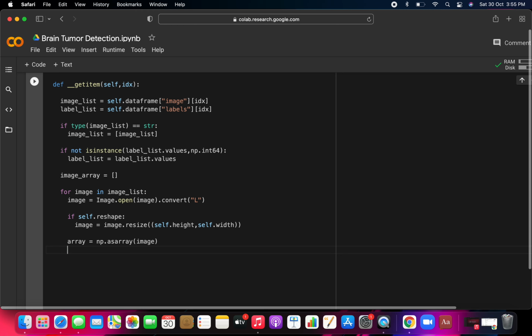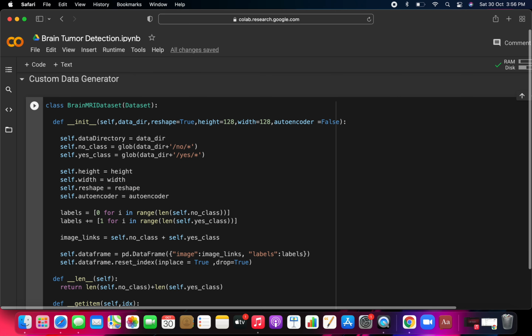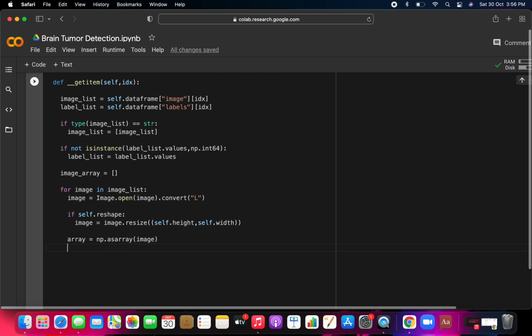For that, I think you can use an autoencoder, because whenever we train this particular model, an autoencoder is really easy. It is reconstructing what you gave as input to that model, the same image.